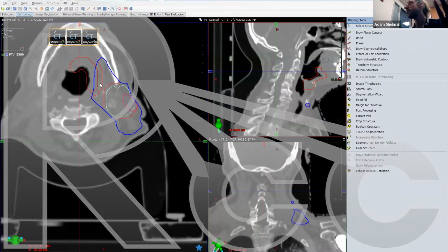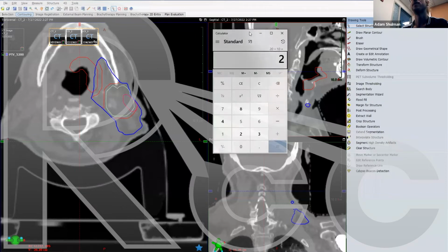My shoulder doesn't know where it is. So subtract it out so we can limit 5% or 8% in my actual PTV of 52. And we won't worry about that sharp increase in dose between 52 to 63. And so again, you would just do the 52 divided by 63. We're looking at the dose fall off for the margin for my max structure of PTVs.